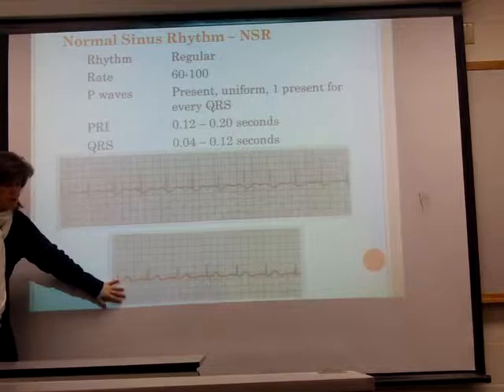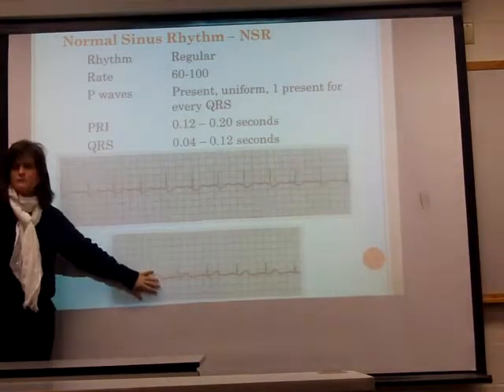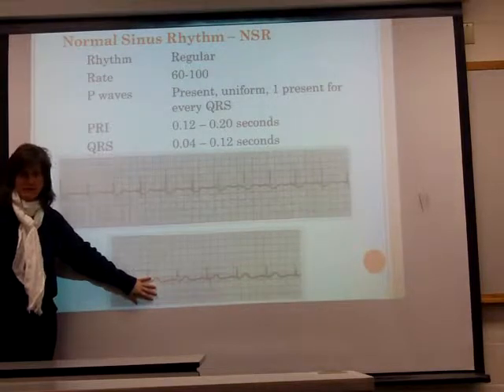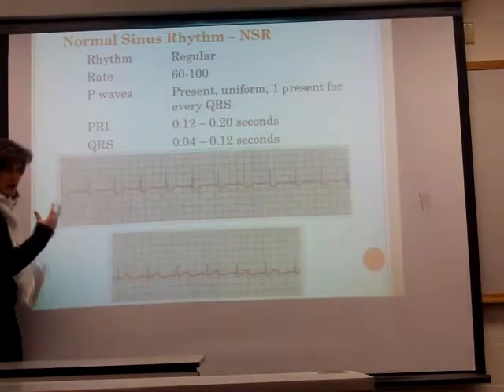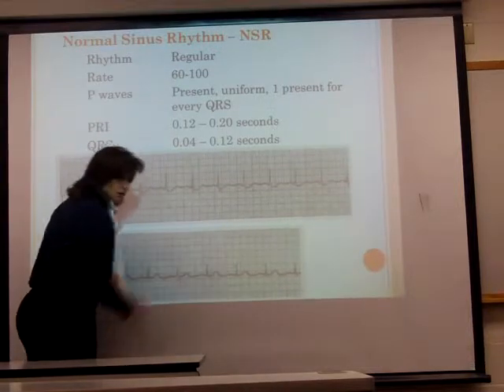Moving down to this strip, this is also normal sinus. And again, this is about a 4-second strip. Don't worry about that. I won't give you this on the exam. I just want to show you, again, looking at regularity. This is very, very regular all the way across.